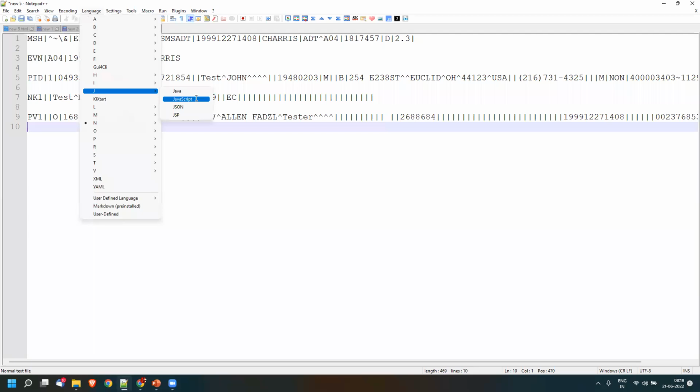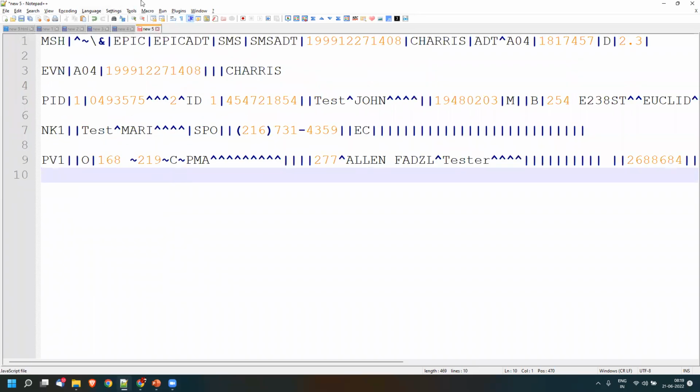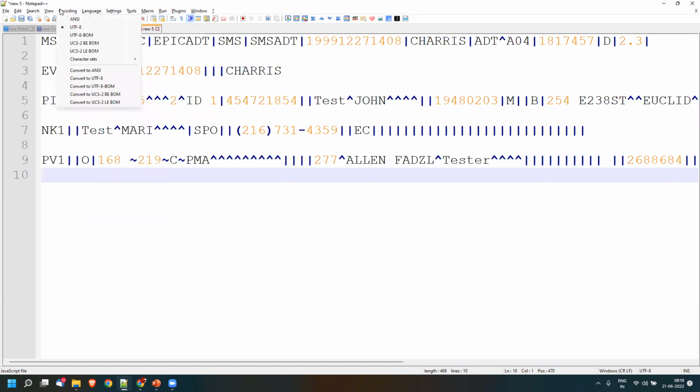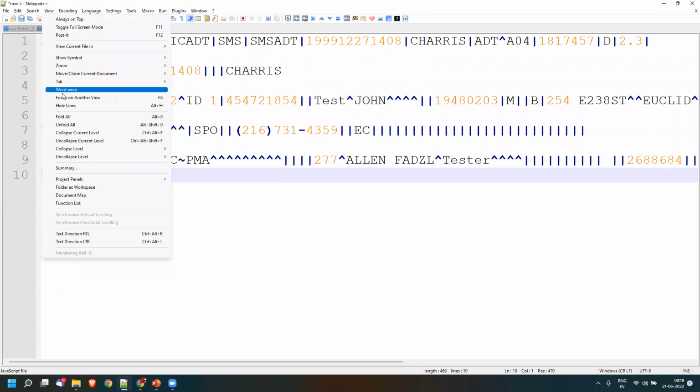This is not JavaScript. I just set the language to JavaScript because otherwise I come across the question, is it JavaScript? I'm just setting it because it is colorful, easy to separate, and easy to understand. Let me set it to word wrap.